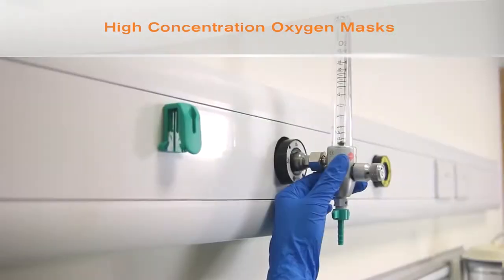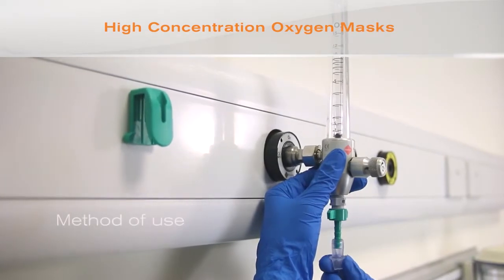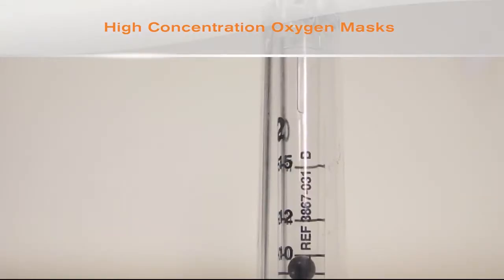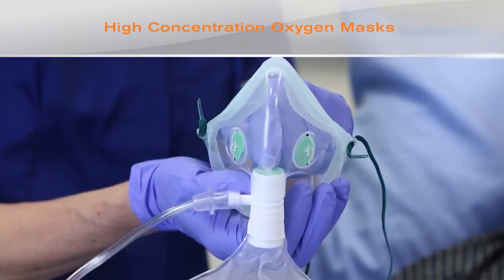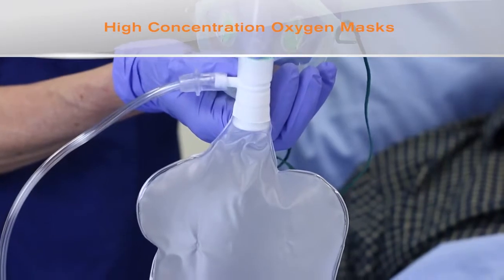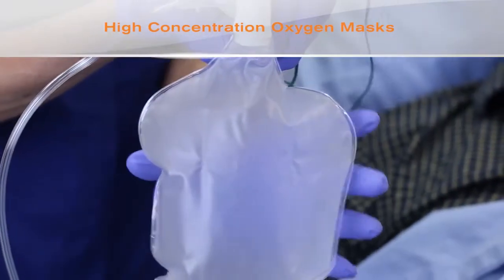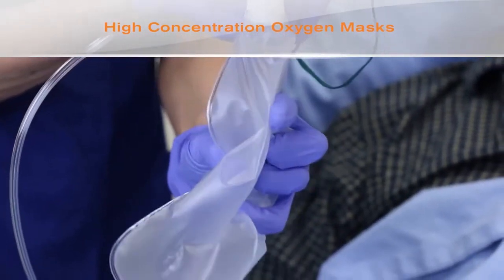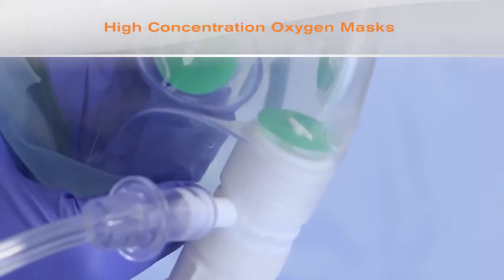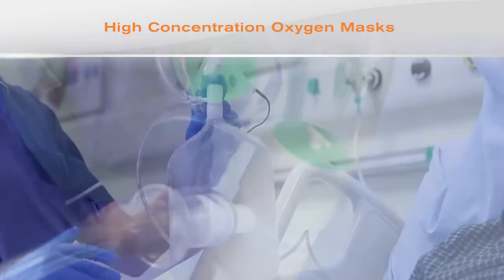When using the high concentration oxygen mask, first attach the oxygen tubing to the oxygen flow meter and set the flow rate to 15 litres per minute. Occlude the inspiratory valve, being careful not to damage the valve, and allow the reservoir bag to fill. Squeeze the reservoir bag to test the patency of the valve between the reservoir bag and the mask. If the reservoir will not empty, discard the mask, choose another and test again.